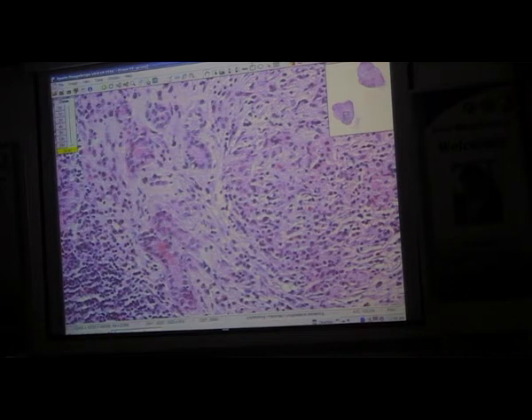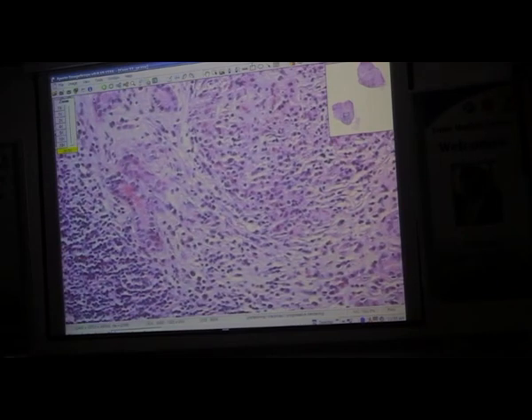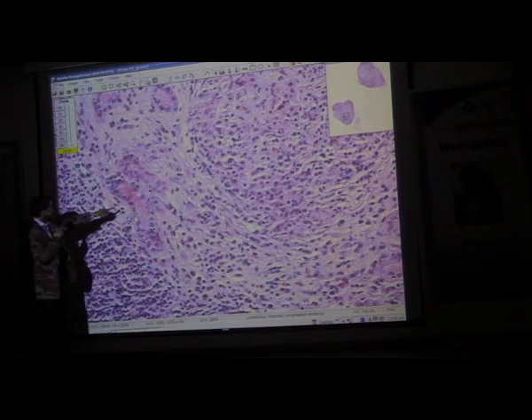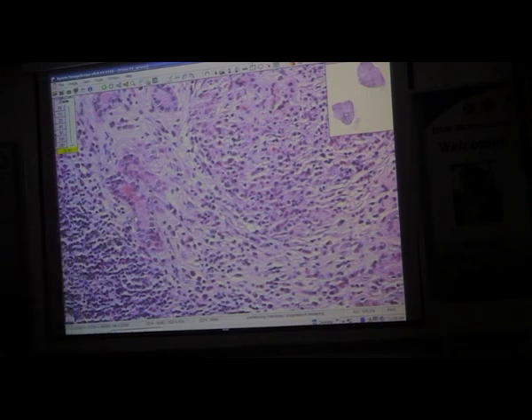So let's talk a little bit about lacrimal gland pathology. And now I'm going to ask my pathology colleagues that if I make a mistake here, you will correct me too, okay? All right, good. When you are looking at the duct of the lacrimal gland, I want you to pay attention to the layers of cells here, and this is a great place to look. You think a ductule has one layer of cells. Here you have an epithelial cell, and you have a flattened cell just outside the epithelial cell, which we'll call a myoepithelial cell, which becomes very, very important in lacrimal gland pathology.